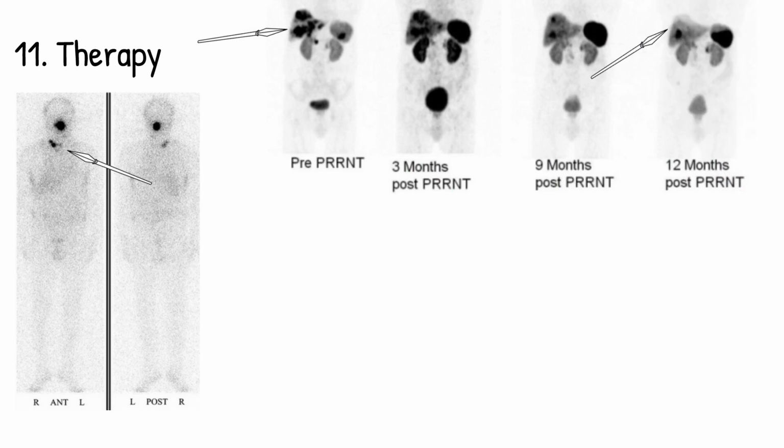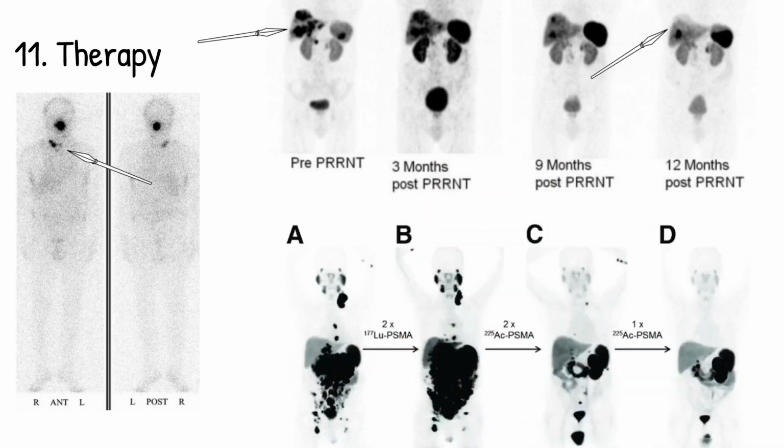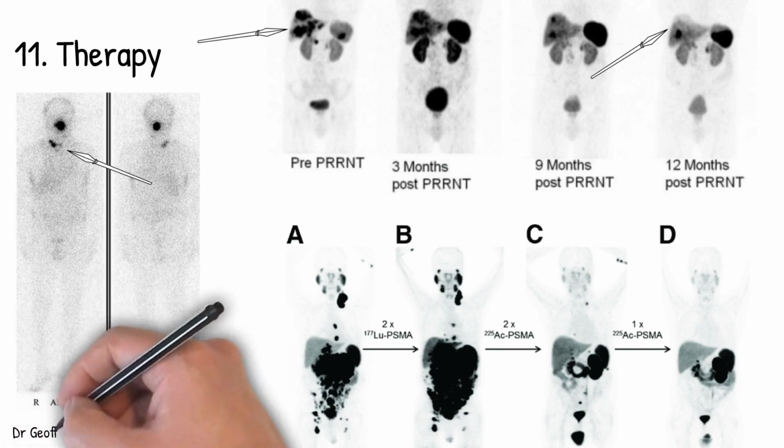Here we can actually see somatostatin receptor therapy with lutetium-177, and you can see the improvement over a period of 12 months with those arrows with disease in the liver. We've also developed newer tracers that are alpha emitters as well as the original beta emitters, and here you can actually see PSMA in prostate cancer improve the outcomes using actinium-225 over lutetium-177.